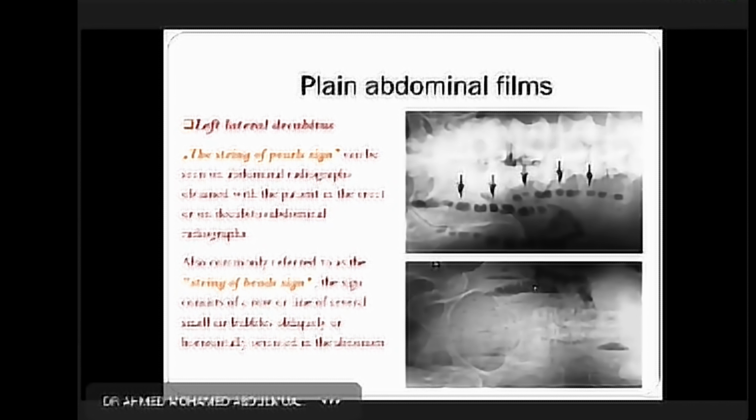And here also we can see multiple air fluid levels with a stepladder appearance. Also we can see it in left lateral decubitus as an alternate for erect abdominal x-ray. So we call it string of beads.